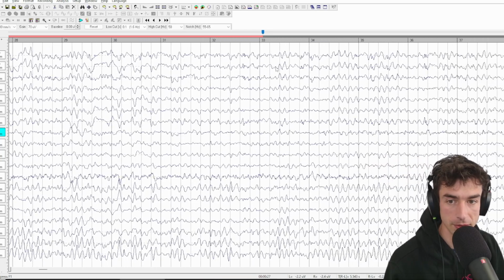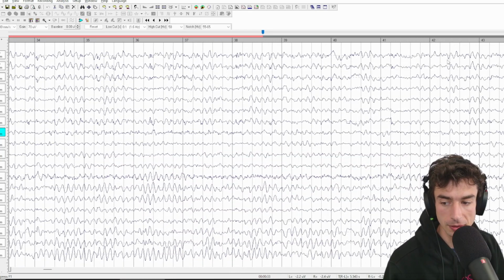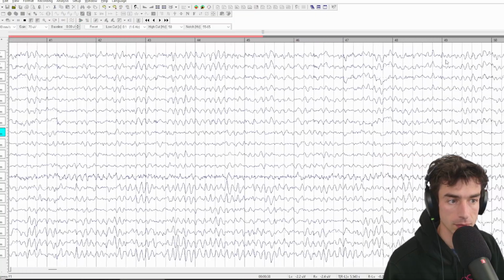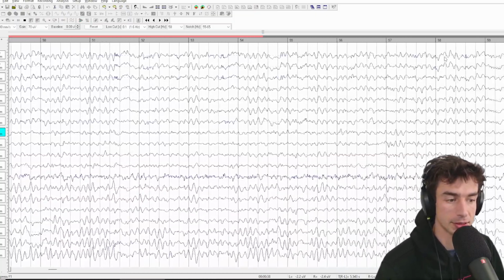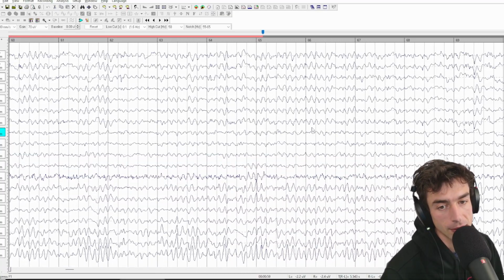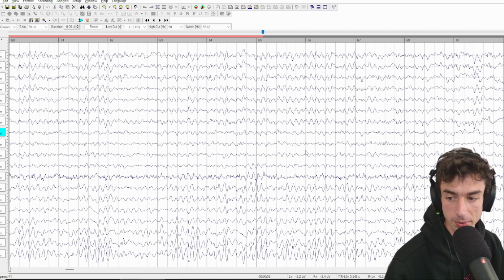And it looks like we will need to remove a little bit of eyelid flutter using the ICA. And the eyes closed can be interesting in that sometimes we don't see a whole lot going on, and other times we see even more going on than the eyes open.